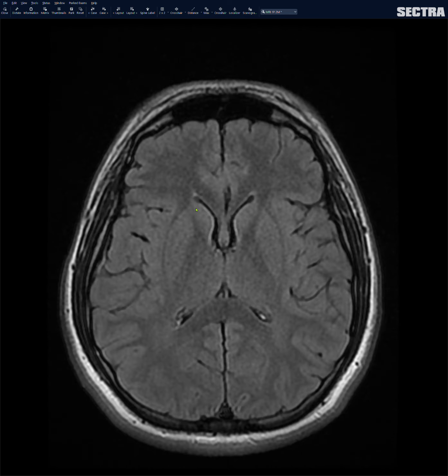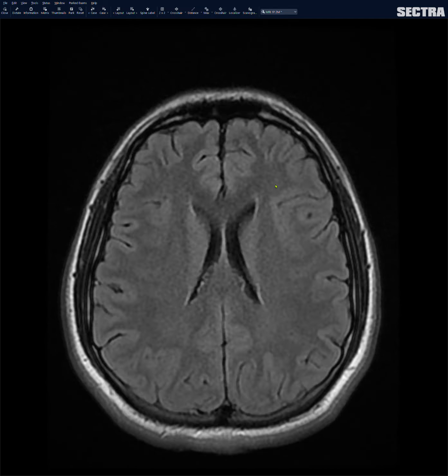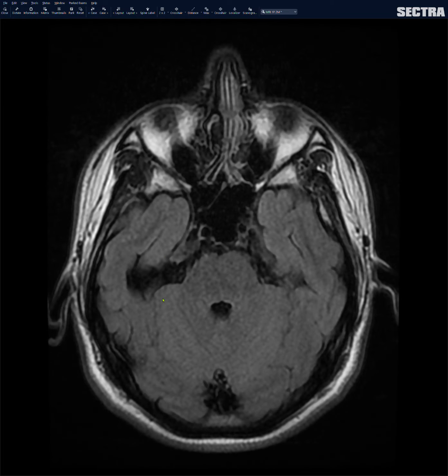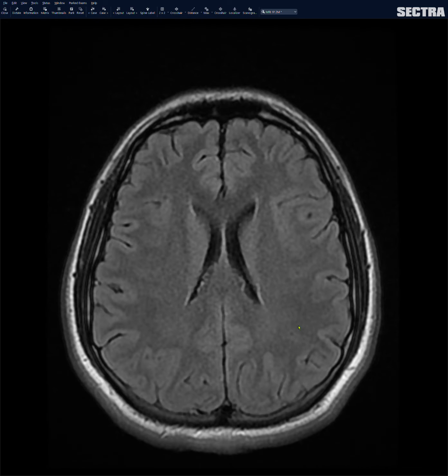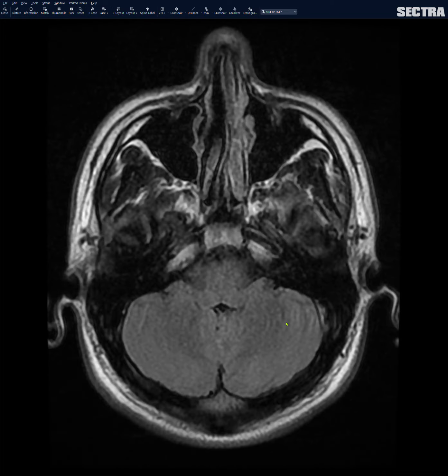Okay, and then after clearing all the gray matter structures, including the thalami and basal ganglia, I look at the white matter. It should be nice and dark, like the frontal white matter on each side. Okay, I look at the corpus callosum. I don't want to miss a white matter lesion there. Look at the bilateral temporal lobe regions. Then look at the cerebellar white matter, parietal occipital lobe white matter, and I look at the left side, the parietal occipital lobe white matter, and the cerebellar white matter. Okay, now I clear the white matter.